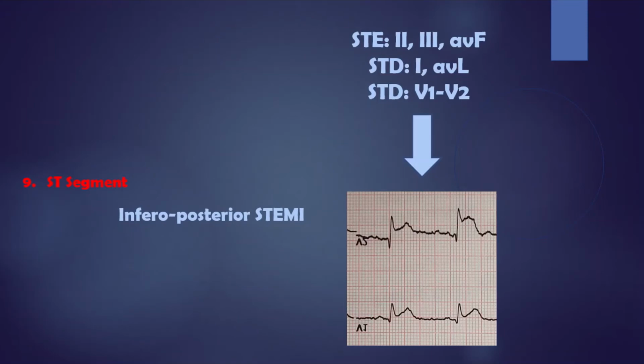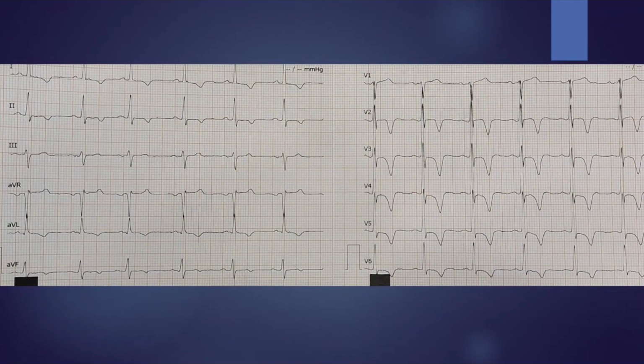What do you think the culprit artery is over here? The right coronary artery. What do you think is going on over here?